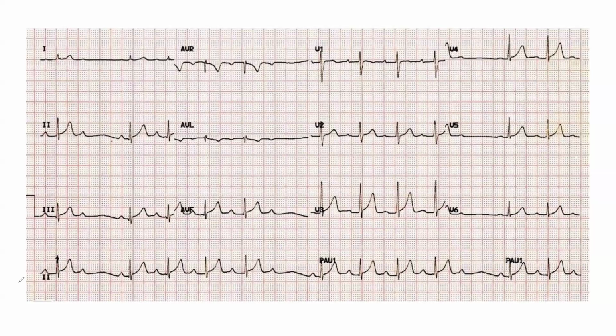Next one, the heart rate. Let's calculate the heart rate. How much should the heart rate be? In this case, you have to take a longer interval.